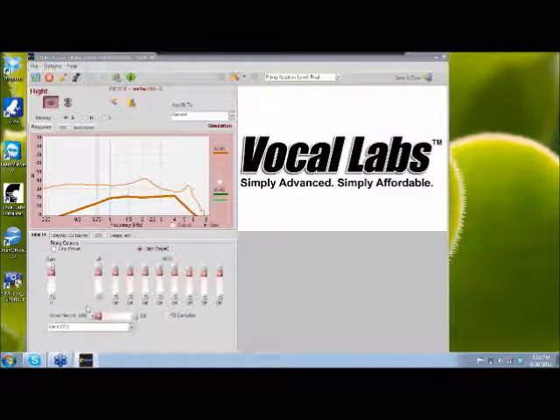Okay, what we want to do next is our input mode. We can see that Omni is picked here for an Omni microphone. I'm working with a product that actually has adaptive directionality, fixed directionality, and a telecoil. So for my very first program, I'm going to give the patient adaptive directionality. With directionality, you have these different directionality plots to choose from. And the way to think about it is your patient's head is right here in the center, and they're looking in this direction. So you can see the sound plume of where the directional microphones are enhancing the sound and cutting out the rest of the noise.